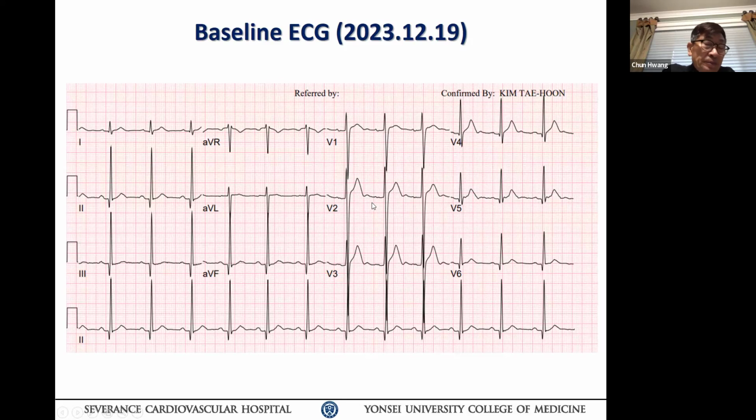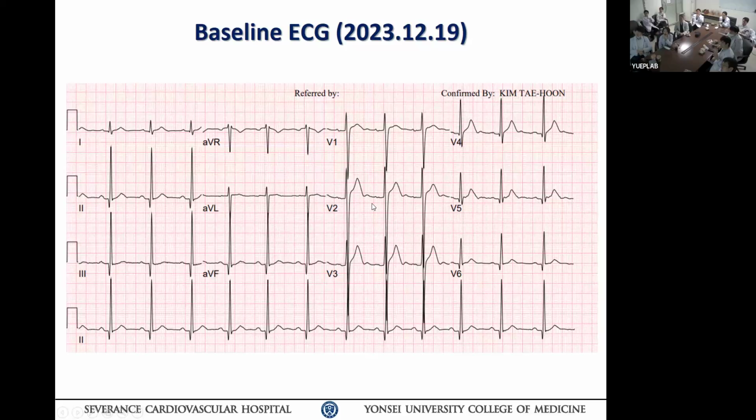Now let me tell you a little bit about the U wave. 프리코디얼 리드의 V2나 V3의 아이솔레이티드 U 웨이브 보실 적엔 인터프리테이션 조심하셔야 돼요. 그 이유는 mechanical artifact from the your apical impulse, mechanical artifact transmission to the anterior chest wall, especially when people have a very thin chest. Okay? 그런데 how do we know this artifact or this is a truly a U wave? U wave most of the time, unless extremely pathologic, they are same axis as the T wave. Understood? 보면 T 웨이브랑 U 웨이브랑 axis가 똑같잖아. 올라가도 positive이지? positive, positive.